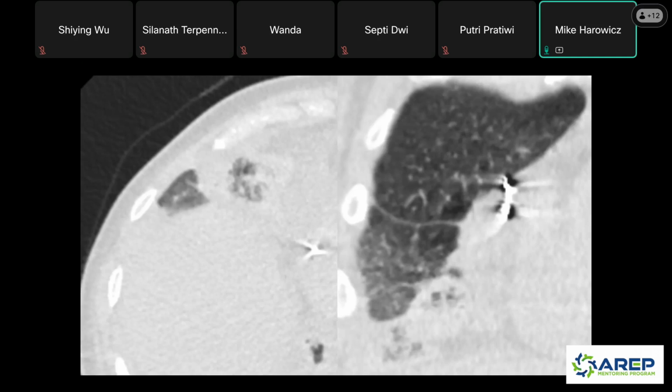So very odd, not something that the team expected, right? Because they were just kind of looking at anatomy, thinking about doing this LVAD. They wanted to look at the aorta, and this is what we found. Anybody have any ideas of what this might be, or maybe what a differential could be for this?